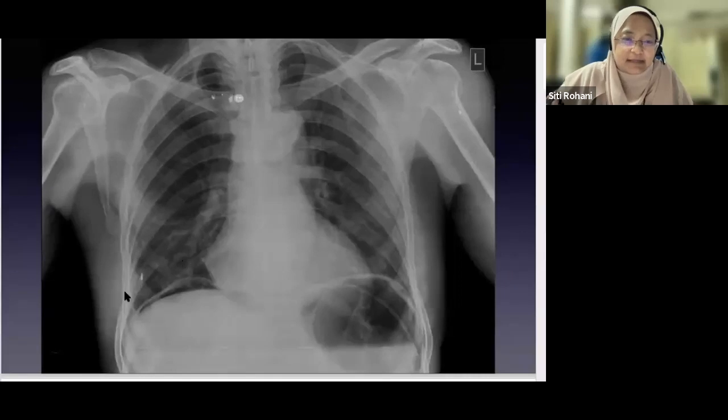You can easily detect it on the right side because we have our liver on the right side. That line represents our right hemidiaphragm. Gas below that hemidiaphragm is pneumoperitoneum. Gas above the diaphragm is air inside the lung. Okay. On the left side, it's quite tricky because on the left side we have our stomach, gas in the stomach, gas in the bowel.